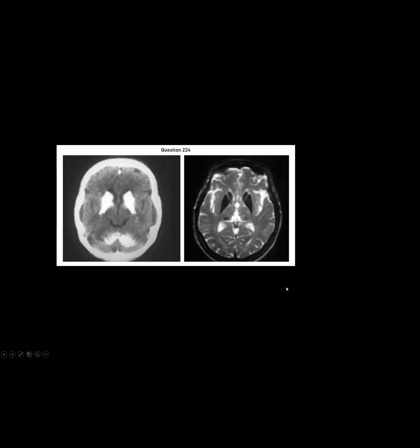Dr. Land, this is another metabolic disease involving the basal ganglia bilaterally, causing dense calcifications that are also within the cerebellum. There's a differential for this, but what do you want to think of on a test if you see this? I'm going to say it looks like Fahr disease.